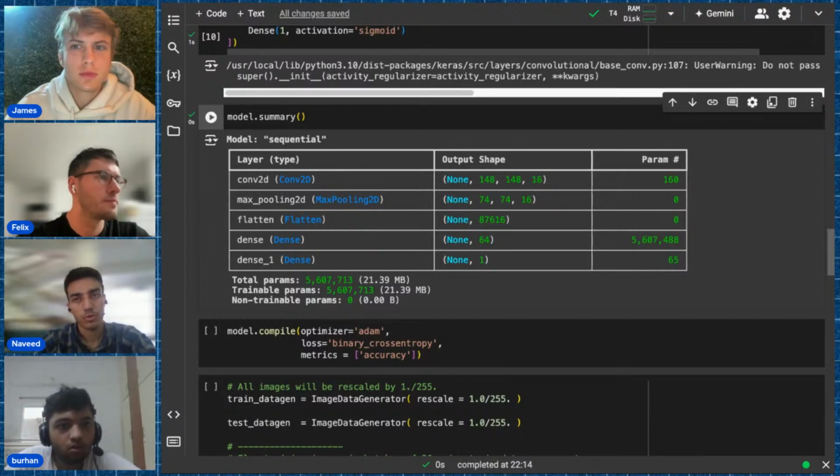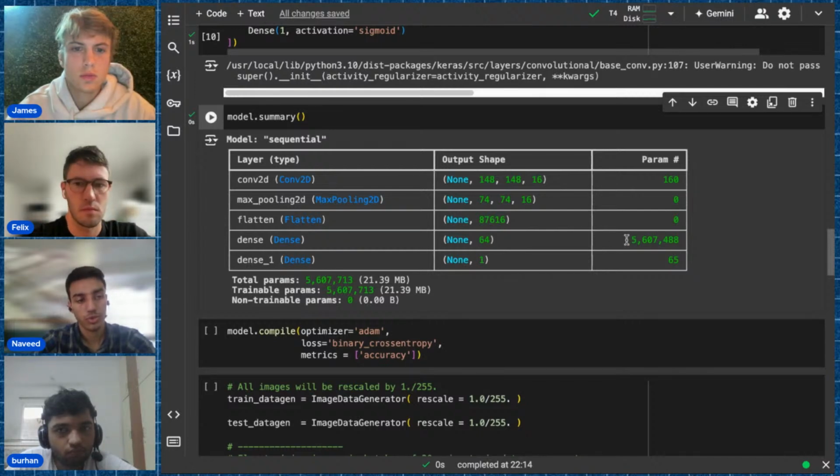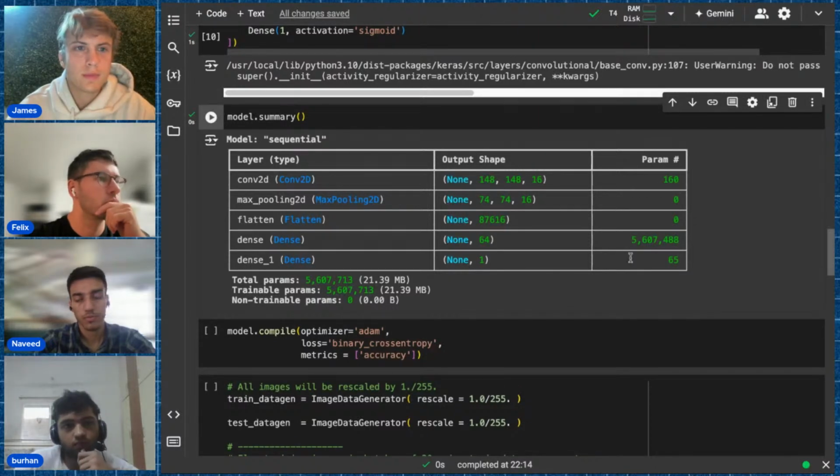This is probably one of the drawbacks of using a fully connected layer directly instead of passing it through the convolutional filters. In that case, you would have to take every single pixel and connect it to every single neuron in the fully connected layer. That's why they're called fully connected. We can also skip these dense layers in our CNN architecture if we would have some, let's say, memory constraints or computational constraints. We can directly work with just the CNN layers as well. But since we don't have any such constraints here, we can proceed with this model.